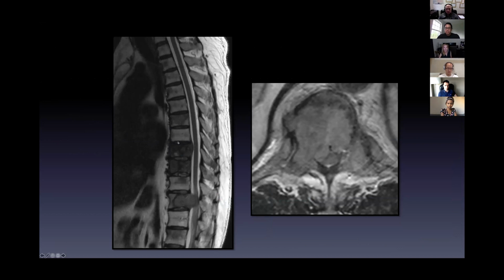So you have a case like this, renal cell carcinoma, multiple bodies involved. This one down here is obviously the most important one. Sagittal T2, we've got the MET coming out into the canal, compressing the cord. This is the axial T2. You see the epidural disease compressing the cord. Now, most tumors go to radiation first. Now, if they're stable, this is stable actually. But if you radiate this, you're going to radiate the cord, right? So we can't do that.